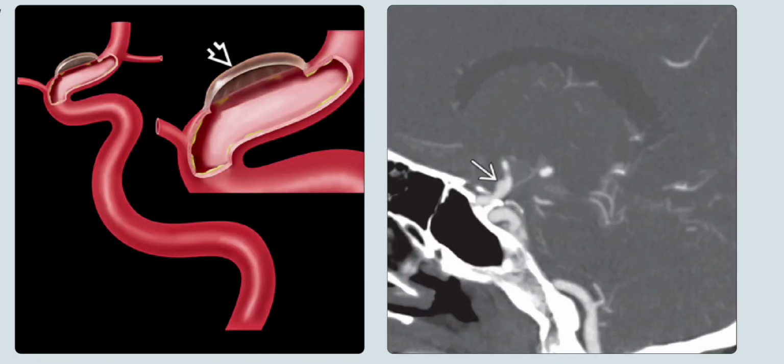Left is a sagittal graphic, and it shows a blood blister-like aneurysm, which is seen to be arising from the dorsal superolateral wall of a supraclinoid internal carotid artery. The blood blister-like aneurysm is covered only by a thin fibrous wall.